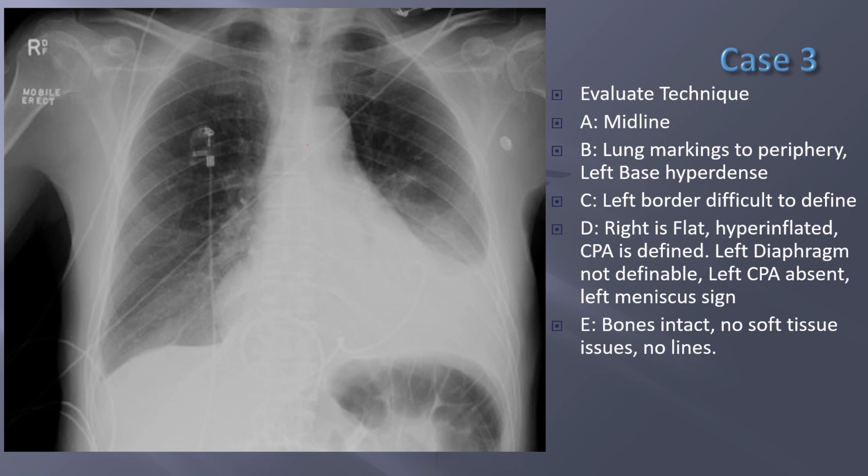It's kind of hard to tell, but it's somewhat midline. I don't think it's deviated. I think if it was deviated left or right significantly, we would see that. So I'm assuming it's kind of midline.